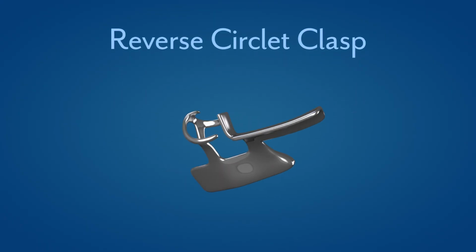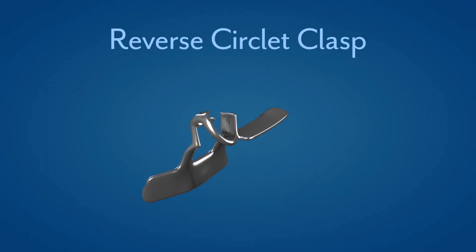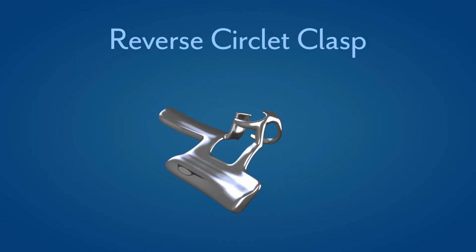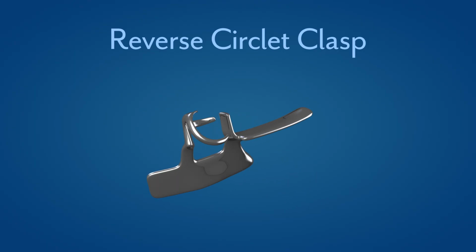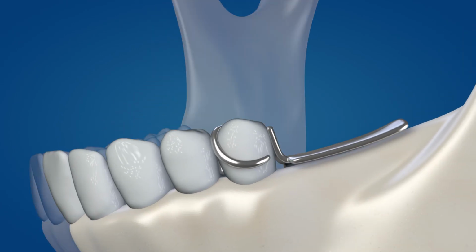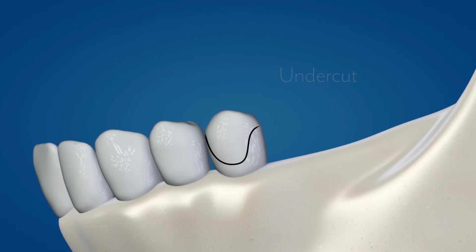Recognizing the damage created by traditional circlet clasp assemblies, providers sought alternatives to avoid the associated bony destruction and abutment loss. Among the first alternatives to be explored was the reverse circlet clasp assembly. You will notice the height of contour in this instance is different than what we observed with the circlet clasp assembly. The measured undercut is located distally nearest the edentulous ridge and extension base.